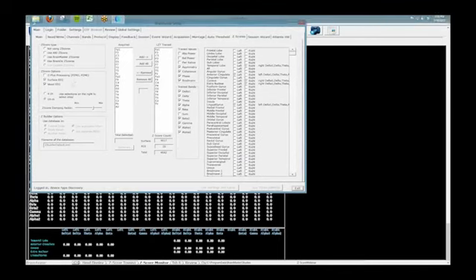So now we're going to notice that this is completely different than what we're used to seeing right here. Not only is Voxel EEG selected, but Surface EEG is selected as well. And now we're going to notice that these aren't grayed out, and that's not grayed out, and you can choose the different portions of it. For this protocol right now, I'm only focusing on the asymmetry, coherence, and phase to go along with this. And you're going to notice right here that it combines the two Z-scores together. Surface is 4617, ROI is 25, and the total is 4642.